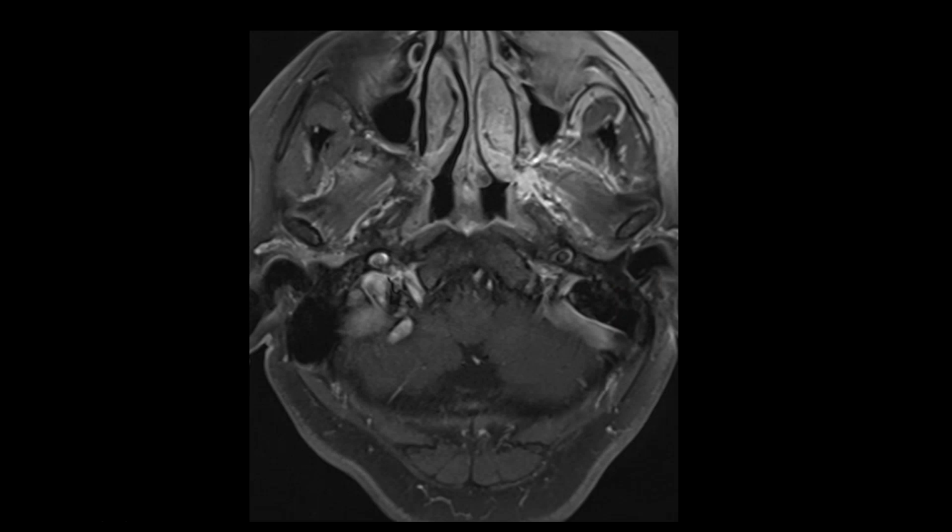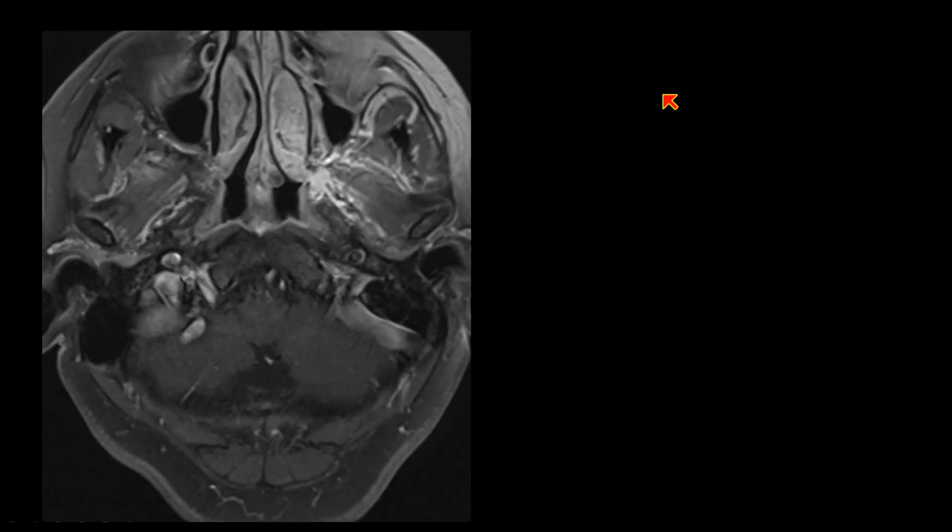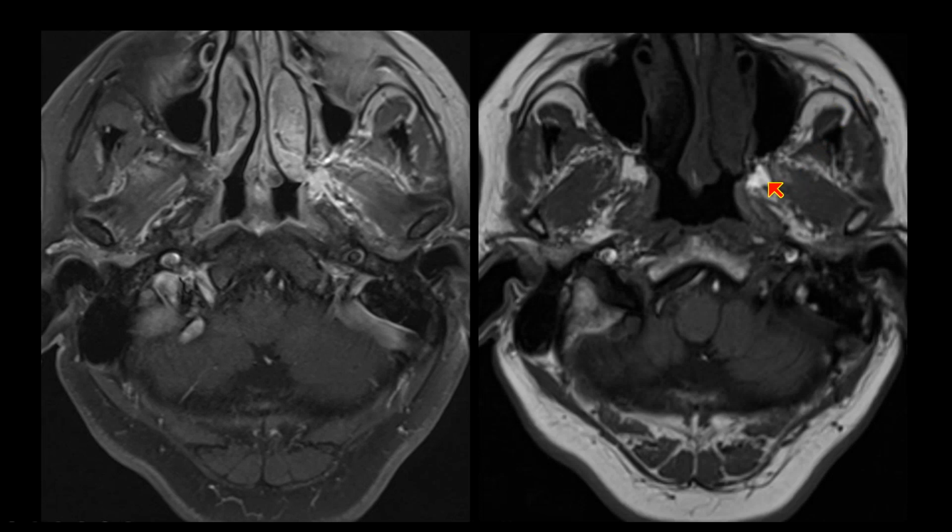Now, sometimes loss of fat saturation can be very confusing for us. This case was thought to be an enhancing lesion at the pterygoid plates. And if you look closely, you can see we've actually lost our fat saturation of the subcutaneous tissues. And if they had just paid more attention to the pre-contrasted T1, they would have seen that this area was actually bright before contrast. So I remember the nose. On this post-contrasted image, the nose is bright, so I know that's post-contrasted. And here the nose is dark, that's pre-contrasted, so I know where there is contrast and where there is not.